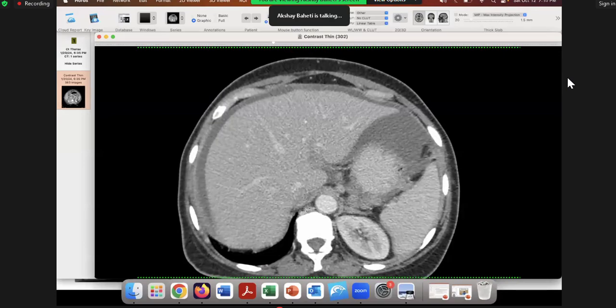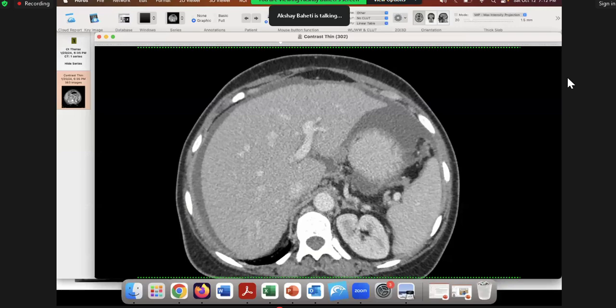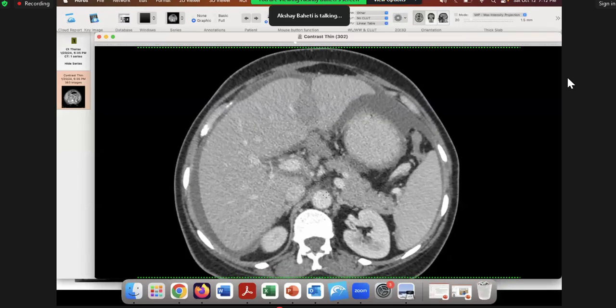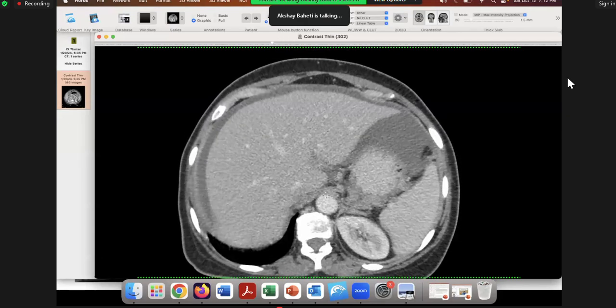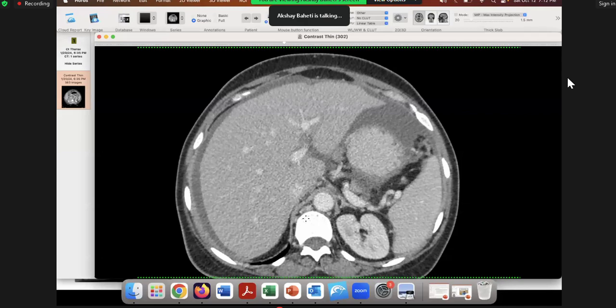And for that, you need to know where it will most likely go, right? So in a regular case, I'm not going to focus on the retrocrural region per se. But in every case of ovarian cancer, I'm going to look here because I know that ovarian cancer has a propensity to go to nodes, and it can actually go to any nodes. I've seen isolated axillary metastatic adenopathy as well. So it can go anywhere.